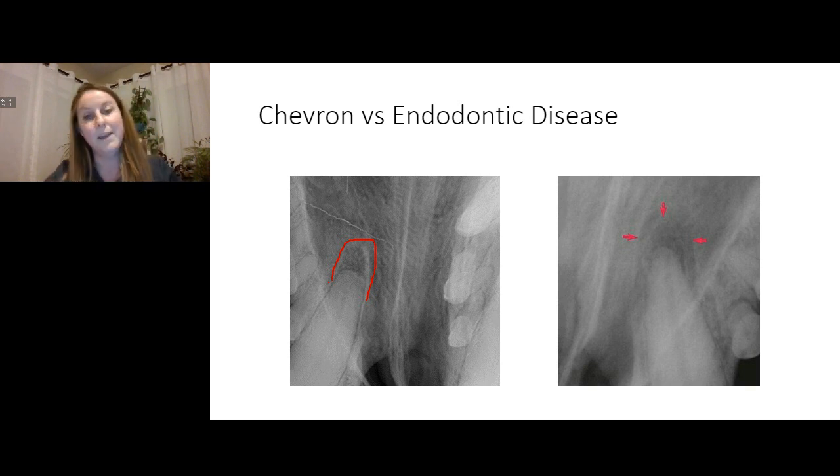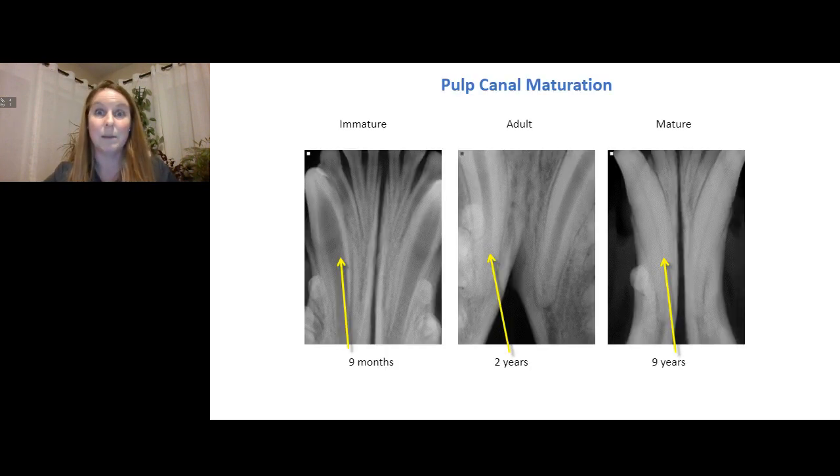On the other hand, over here, you can see this halo appearance, which is not just a smooth round thing at the end of the tooth like we had on the other side. Here we have this halo appearance, and then around that apex, a blunting of that apex. We no longer have a really distinct periodontal ligament space, which is this black space going all the way around the tooth here. We kind of lose where it is in this area. Yeah, it's gone. So those are the things that we start to look at when we say, okay, that tooth is pretty diseased, actually. We've got to do something about that.